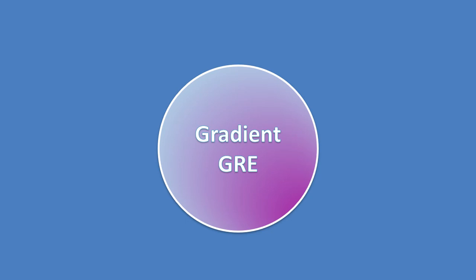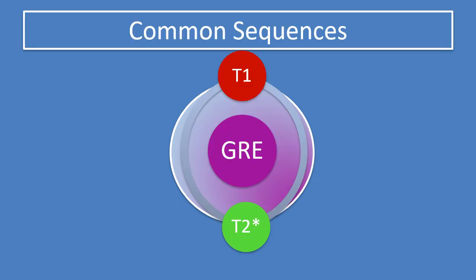Okay, after we have discussed the spin echo family and part of the fat suppression techniques and given a hint about inversion recovery sequences, let's discuss the second family, gradient sequences. Gradient sequences have two important sequences, what we call T1 gradient sequence and T2 star gradient sequence.